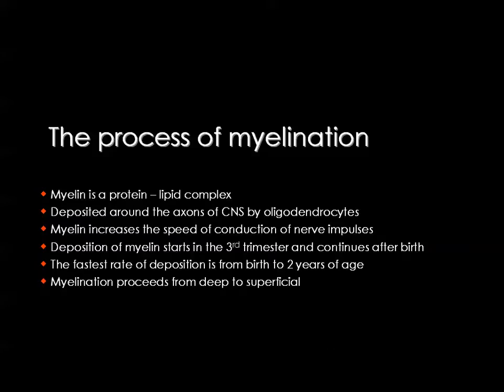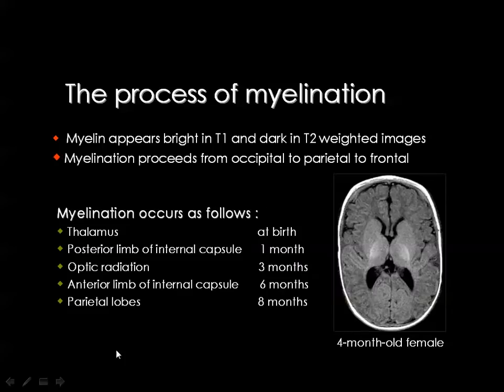So the fetal brain, the white matter contains a lot of water, and before delivery the brain starts to deposit myelin instead of water in the white matter. Then you know that water is black in the T1 and bright in the T2, while fat is the opposite.